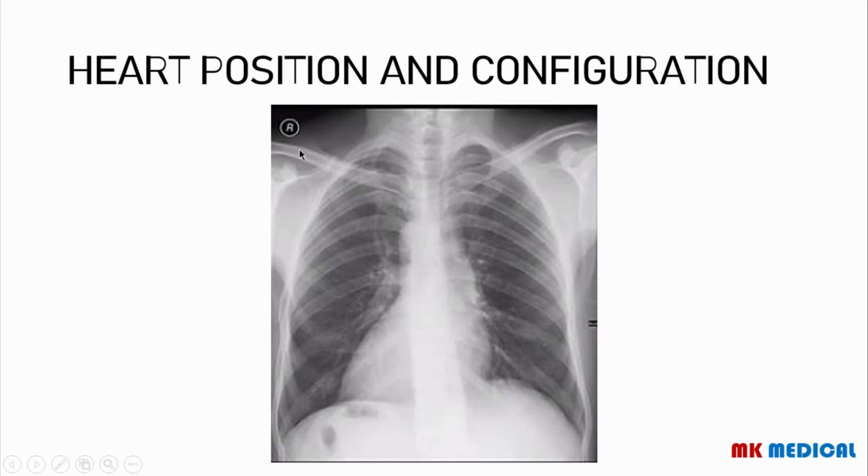As you can see, we are looking at this x-ray the right way. And as we can see here, it seems like even the stomach has been moved to this other side, because you can see that there's the gastric bubble here underneath. So whenever you see that all the structures in the viscera have been rotated or mirrored, we refer to that condition as situs inversus.